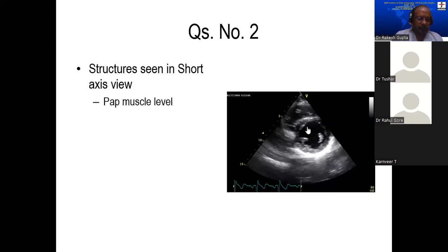This should be... Tushar, you have not studied at all. Sir, mid septum. Mid septum or septum? So this should be mid septum. Okay. And this? This should be mid lateral. Opposite septum, what is the wall? Lateral wall. This segment? This should be posterior segment. Okay. This? Should be anterolateral. This? Inferolateral.